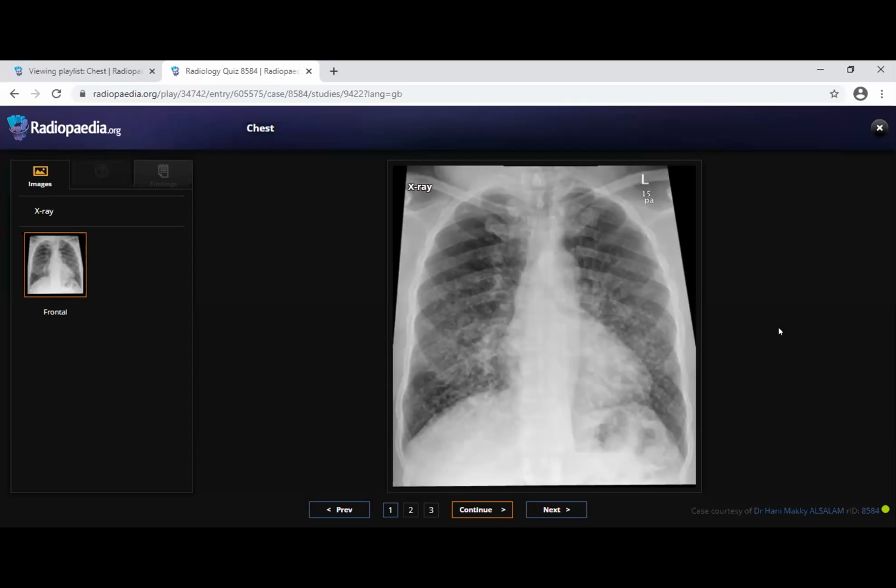If the patient has a history of primary, it could be metastasis. Miliary nodules could be miliary TB if the patient has a history of fever or cough. No evidence of mediastinal lymphadenopathy, no pleural effusion. I would like to assess for any primary: no evidence of lytic or sclerotic bony lesion, no surgical clips.